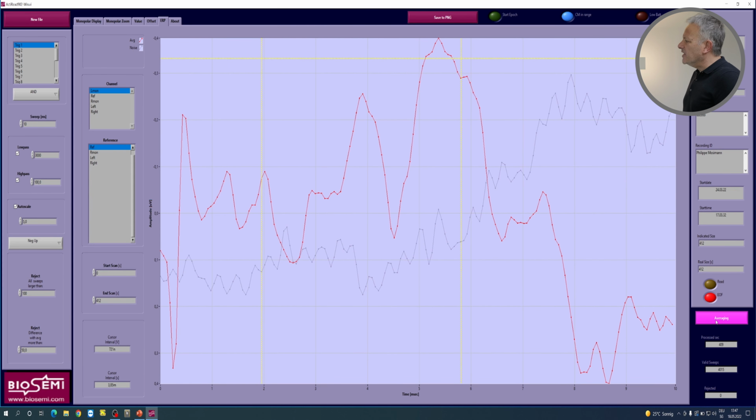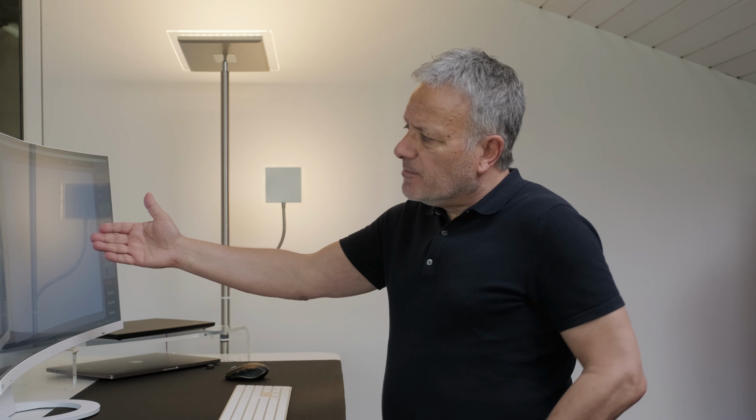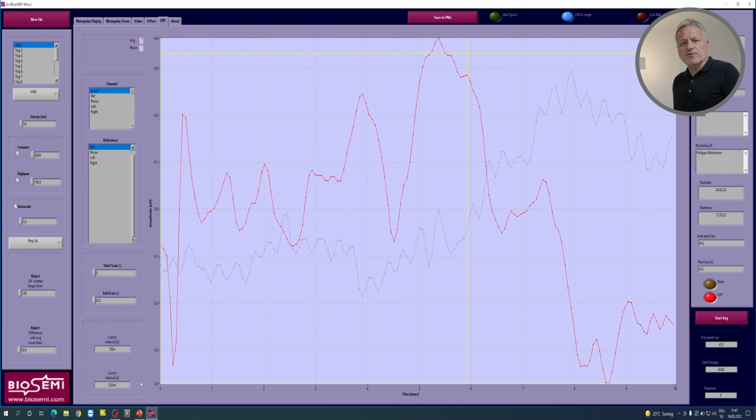As soon as it's finished, we can actually move the marker 5. It's a little bit delayed, but still not that much delayed, over to where we believe 5 is. And we're resulting in about 0.1 millisecond delay. And that's due to the actual filtering. That's due to the actual noise component in the file. You can also see the background noise. It's higher than what we've done with the left channel before.